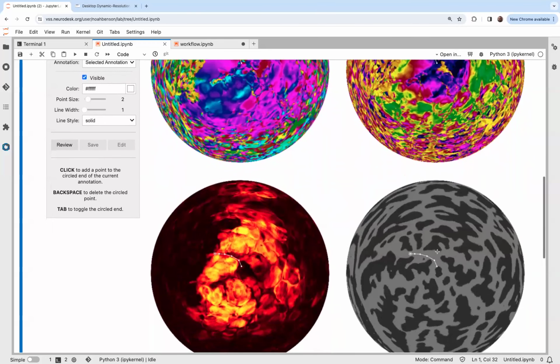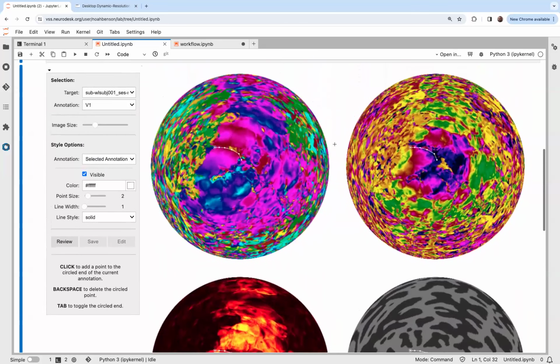There's also maps down here of the curvature, if you just want to look at the curvature, and of the R squared value or the coefficient of determination. So this is sort of a confidence measure in the maps. So we've followed this boundary here, and we're up to the periphery, and we're going to follow this green color.